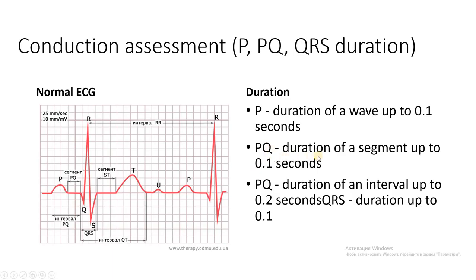The PQ segment is after the P wave until the QRS starting. This segment is up to 0.1 second.